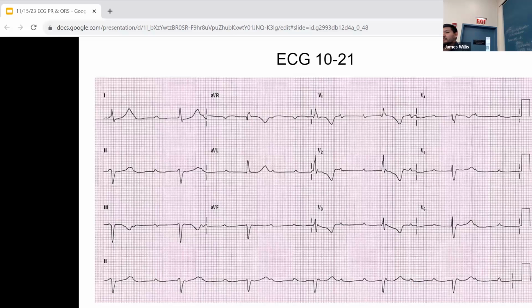This patient's rate is in the 30s, so you still assume the worst. No discharge. I'd worry about this being the more dangerous one. I would err on the side of calling it Mobitz type 2 rather than Mobitz type 1, and watch it. You also have a right bundle branch block and a left anterior fascicular block, so probably unstable.